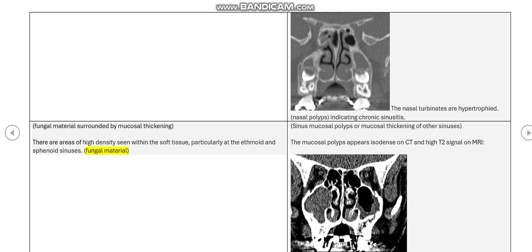Okay, so here in sinonasal polyposis, if you see sinus polyps, the sinus polyps can be associated with nasal polyps, and other polyps in the paranasal sinuses. So here the complete opacification is most likely other polyps. This one is nasal polyp, okay.